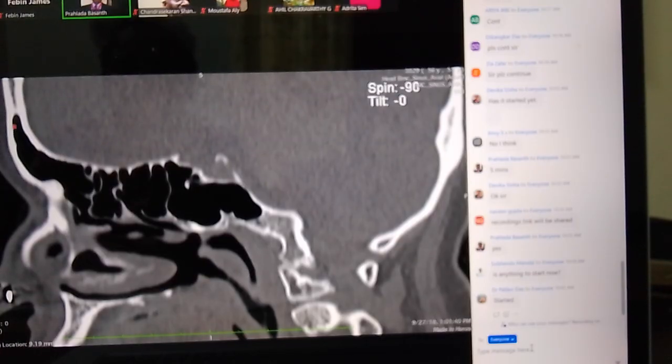So we have written a paper. It's likely to be published soon. I have designed something called the FR line. This is a line drawn from here, the superior portion of the frontal sinus, to the posterior edge of the bony palate here. Draw a line called the frontal recess line. Any cells anterior to that, the frontal cells above the agger nasi, are frontal cells; posteriorly they are the skull base cells, supraorbital cells, and other cells. I will come to that later when we deal with anatomical variations and the frontal sinus.